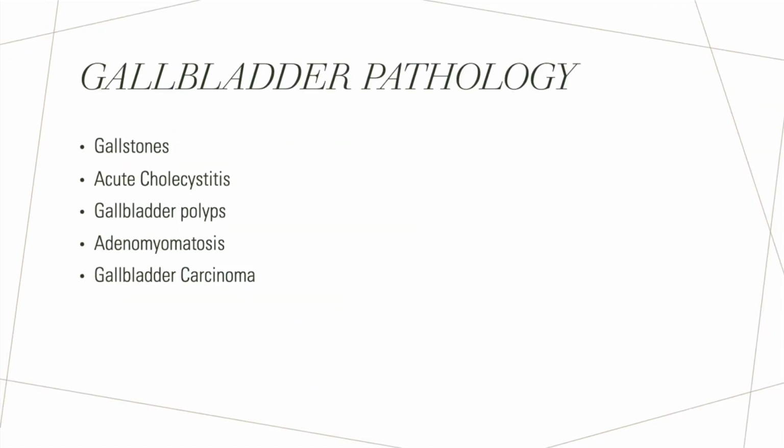So a few pathologies we're going to go through today. We're going to look at some gallstones, acute cholecystitis, gallbladder polyps, adenomyomatosis, as well as gallbladder carcinoma.